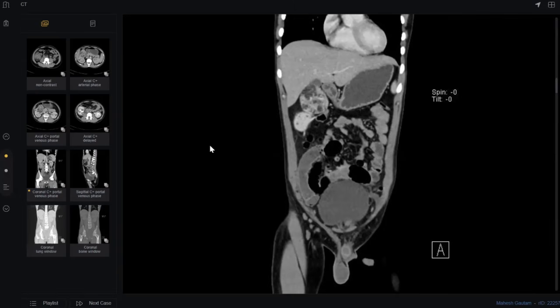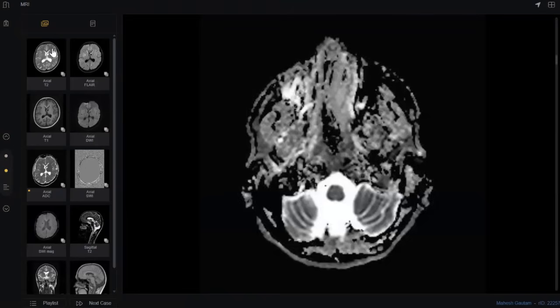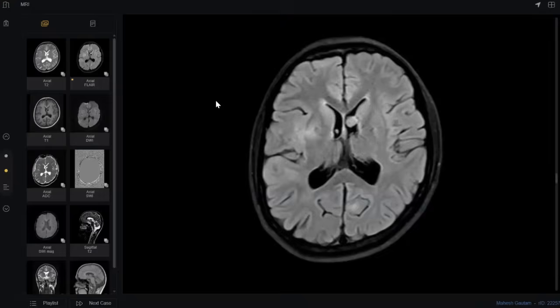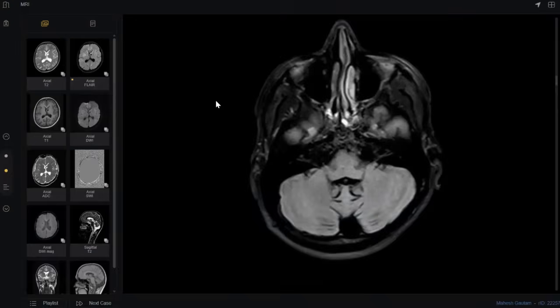What else? The patient has to be started on, and I think ultrasound correlation, correlation with the inflammatory markers. What else? Genetic counseling has to be advised for this patient. What else? I would also screen the brain to look for any spectrum of tuberous sclerosis, to look for cortical tubers. So here I can see the gyri are thickened, which is forming cortical tubers.